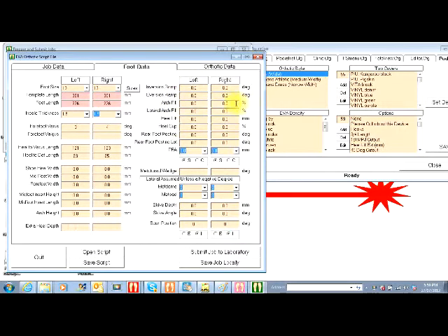Arch fill just increases the arch area by a percentage factor. Lateral arch does the other side. You can put an internal heel lift in up to about 12 mils. After that, you're best off putting it externally. Heel cupping tends to give you higher sides around the heel. Again, that works on a percentage basis.